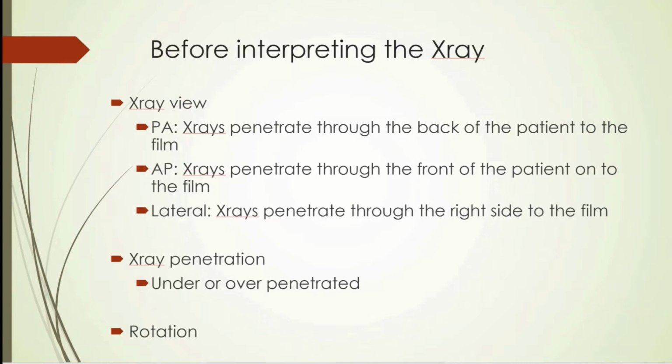We'll talk a little bit about rotation, where the patient isn't straight on to the film or to the x-ray. And there's ways to tell if they're rotated, and it can cause issues with making the heart look bigger, the mediastinum look bigger, etc.